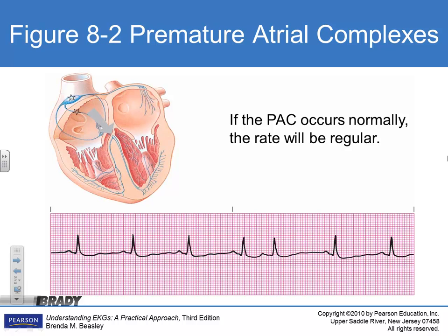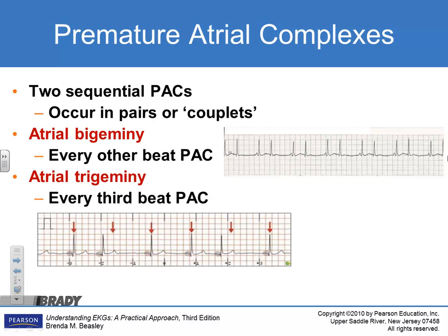Look at this complex. You've got a normal P wave, it's probably got a normal PR interval, upright and tight for the QRS complex. All these others are normal. This is your funky beat. That's going to be a PAC, premature atrial contraction. What that means is the complex came too early. This usually is asymptomatic. Patient never knows it. Any one of you guys can have this and you never know it.